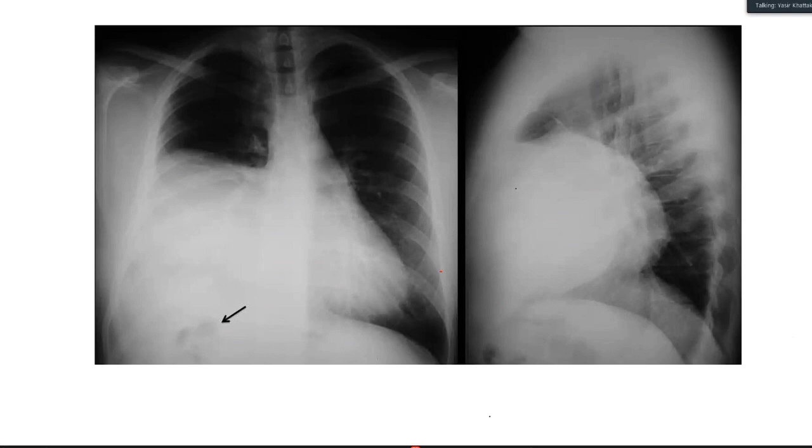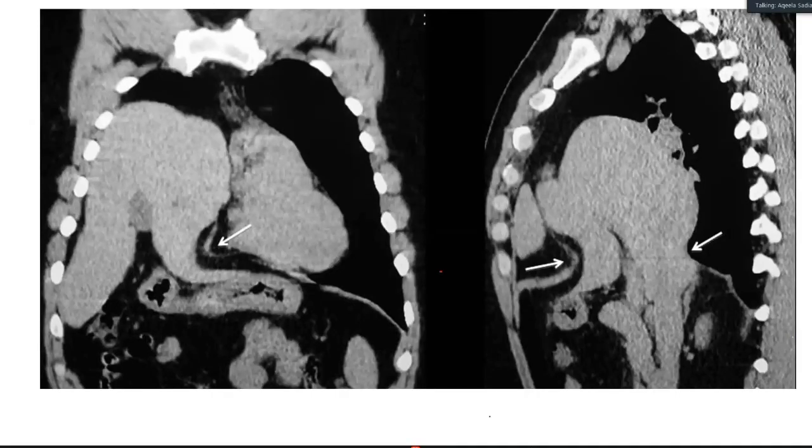Okay. Right. So this is either interposed colon, so the colon has come up between the diaphragm and the liver, or the bowel is in a location where there is nothing else. That means the patient might have some sort of diaphragmatic pathology, as you already mentioned, eventration. But eventration will not have a border like this, not this irregular. The eventration border will usually be a relatively well-defined dome shape. Look at that. You see?